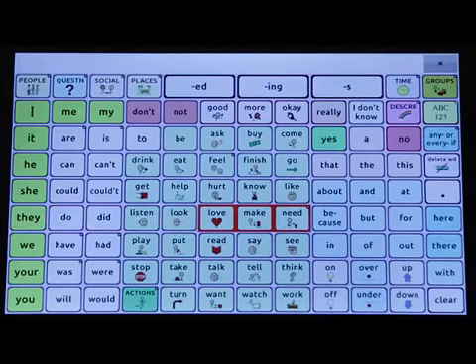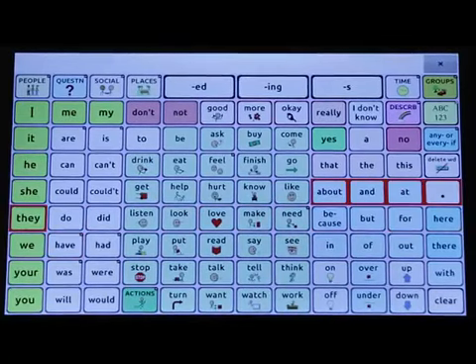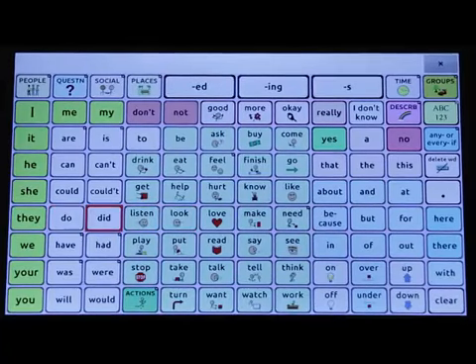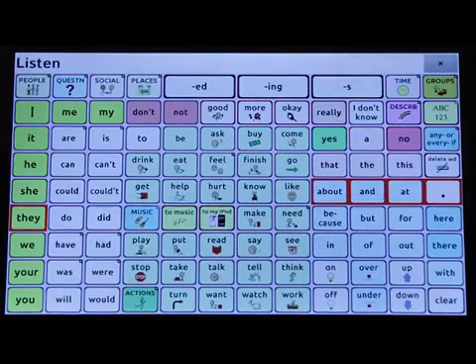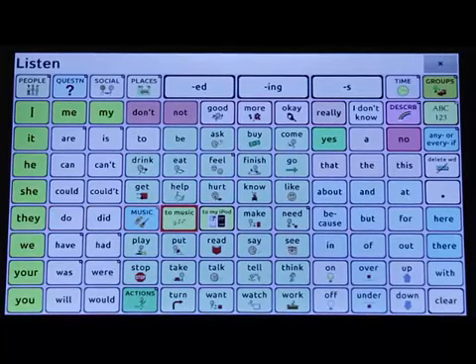Flow. This is a method recently developed by Saltillo. Mathematically, it gives you all the buttons on the page at the same rate, that is, switch hits plus time taken into consideration. It does not have consistency. This might be a benefit to clients that watch their target and can activate the switch when the target within the group is highlighted. Optimization is another feature that I'm going to turn on that will make the flow optimized mathematically.